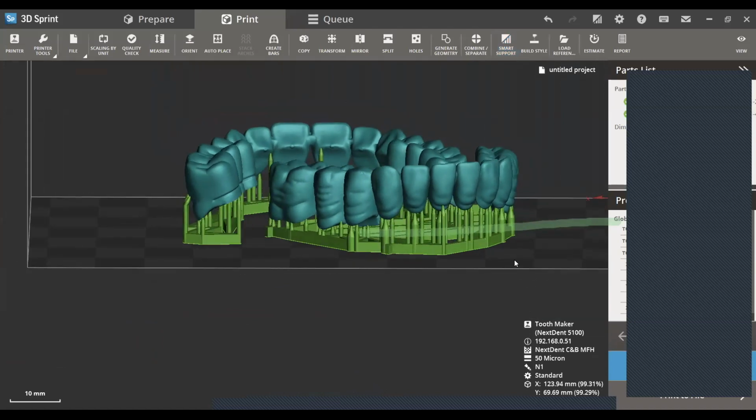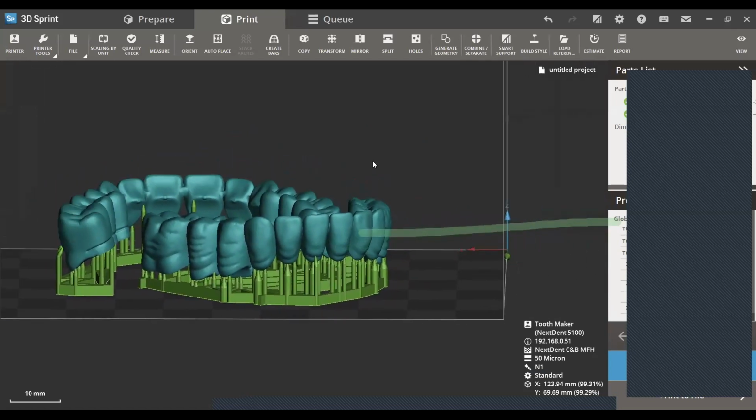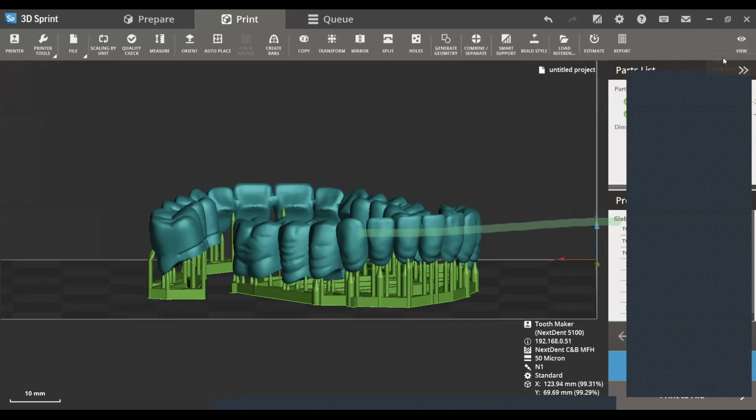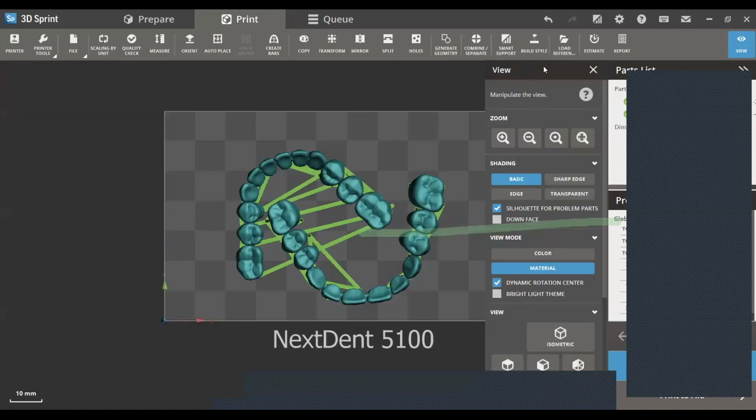Hey, Adrienne, real quick question here from the audience. Ken Kincaid uses 3D Sprint software, but he's unable to move the checkered build plate left or right on the screen to recenter for ease of working. He's wondering what he's doing wrong. Okay, so you're going to hold your right mouse button down and then hold your left and you can pan. So you're going to have both mouse buttons down, but you start with your right. Great. Hopefully that helps. There's also quick views as well. So if you hit view, you can actually just change the views quickly. Perfect. Yep, looks like that helped.